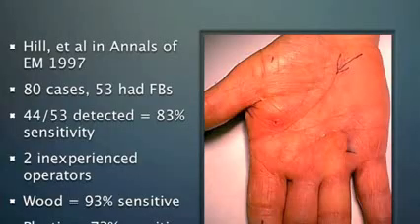And this was a case of a patient who came in who said they fell on an outstretched hand onto a toothpick, and this was the site of entry of the toothpick. And with ultrasound, the toothpick was actually located way over here. Before using ultrasound, if I was even able to see a toothpick on x-ray, I would have really been lured into opening up this area, searching around for a foreign body. However, the ultrasound was very successful in localizing it where it needed to be, which was where the toothpick wound up.